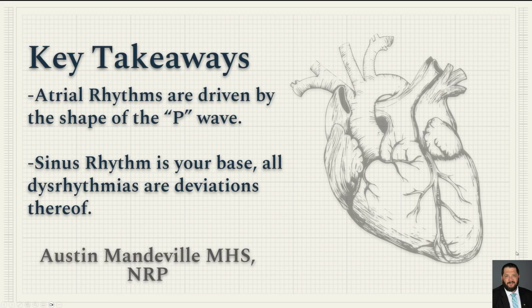Key takeaways: atrial rhythms are driven by the shape of the P wave. The sinus rhythm is your base. All dysrhythmias are deviations of that normal. Practice, let the math be your friend, and remember that interpretation is as much art as it is science.